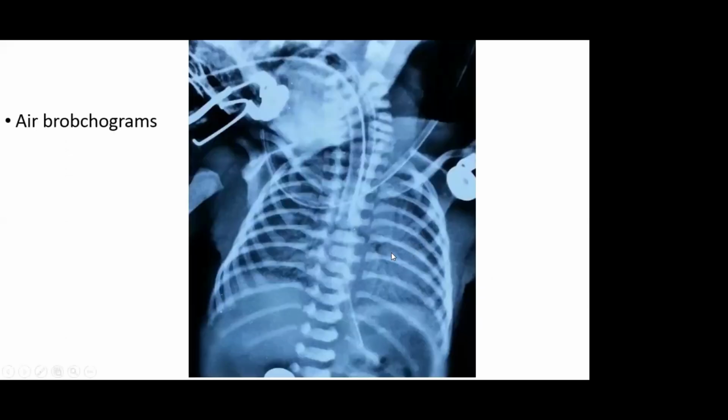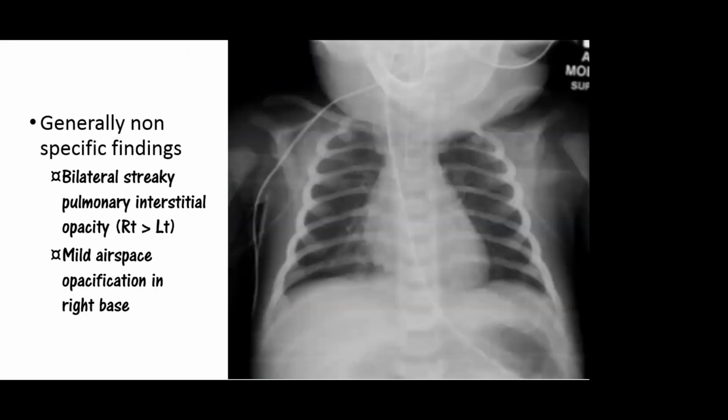So let's see how an air bronchogram looks like. Okay, can you see this part, which is hiding behind the cardiac silhouette? This is how a normal air bronchogram looks like. This part is completely normal. This is not a normal chest X-ray, but this is how an air bronchogram looks like. Okay, you can see on the right hand side those kind of tiny black markings. They run around, and there are some white margins surrounding it. This is air bronchogram, where the air in the bronchus becomes more visualized because of either a thickened bronchial wall or maybe the surrounding parenchyma being thick.